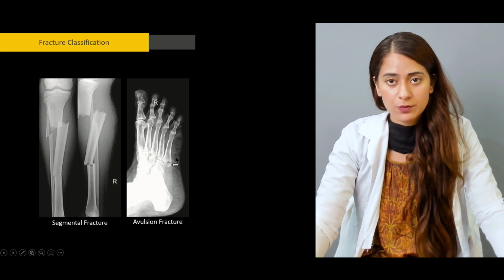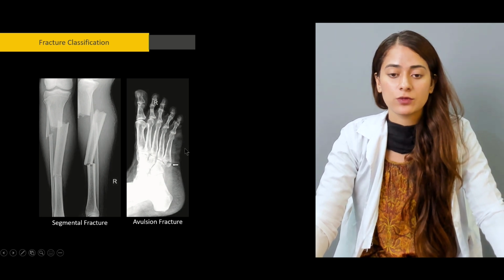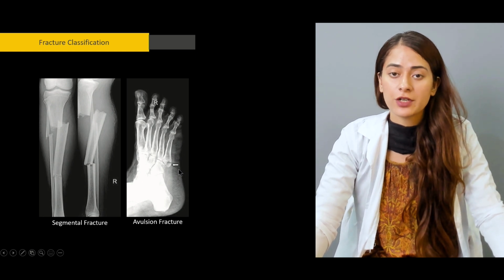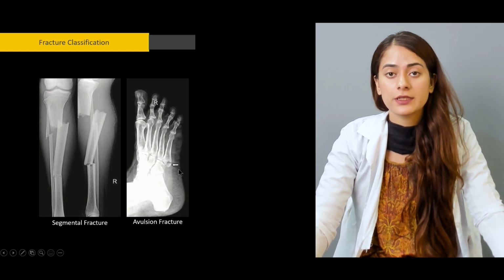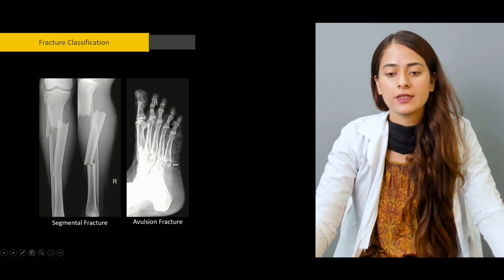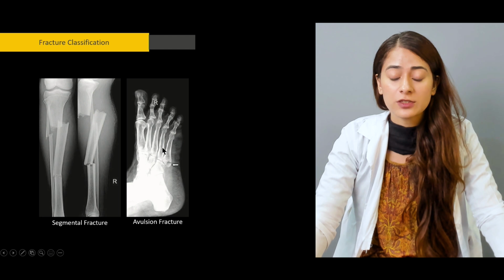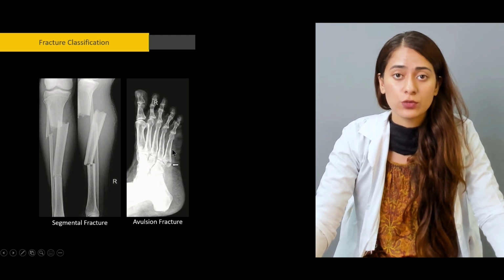So in weight-bearing position, this will be very painful. Normally every fracture, from hairline to comminuted to segmental, is a very painful condition, but this will be painful in weight-bearing, and without weight-bearing, this is probably going to go unnoticed.